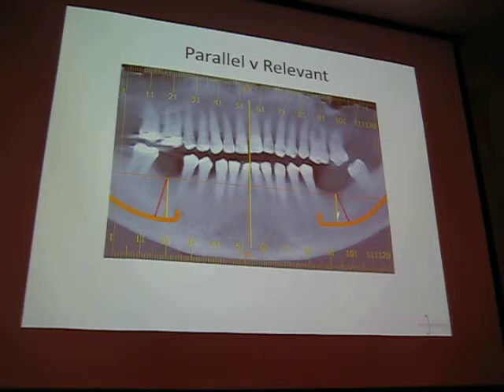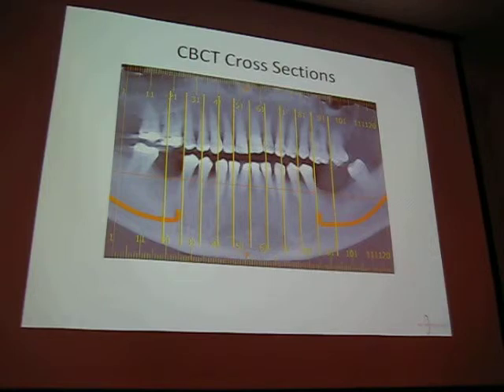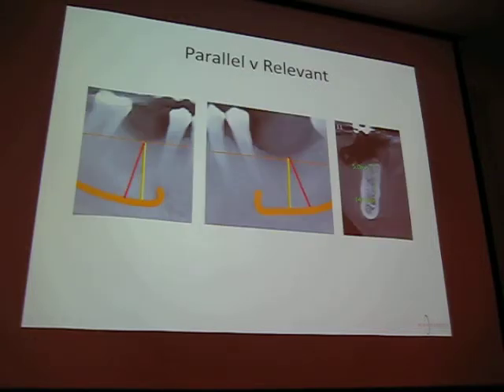So all of a sudden, these parallel slices, they're good. They're better than nothing. You can definitely see any defects, especially lingual defects or internal defects. You won't have that hidden marble in the brick anymore. But you don't know how much room you have. And so when you see this measurement, which one is it?